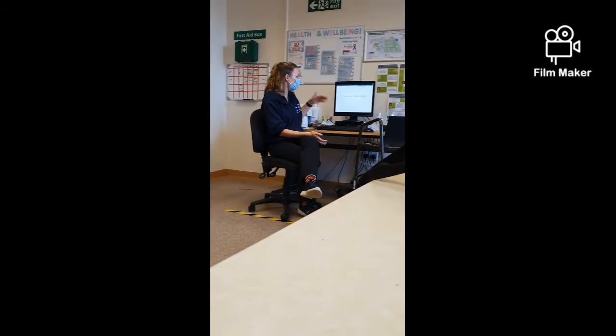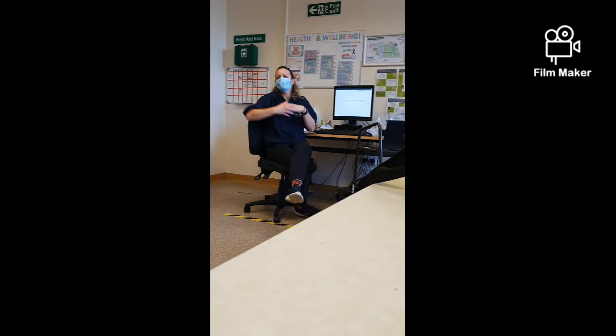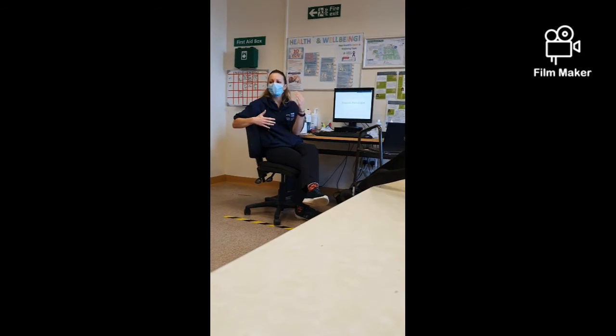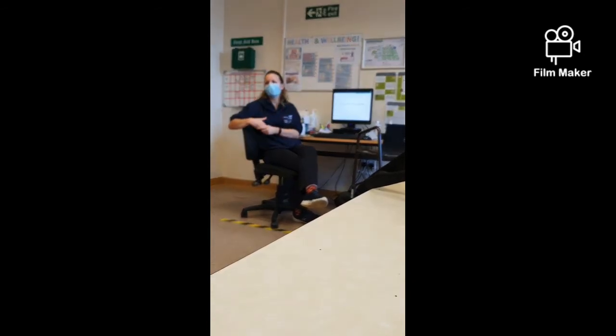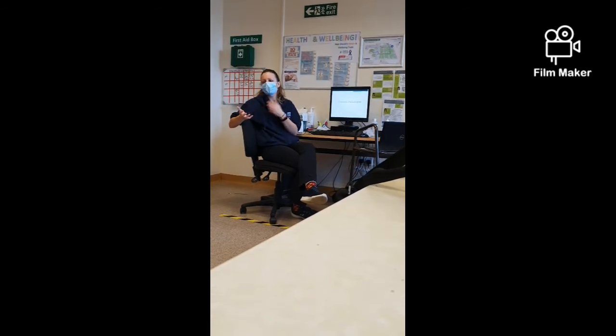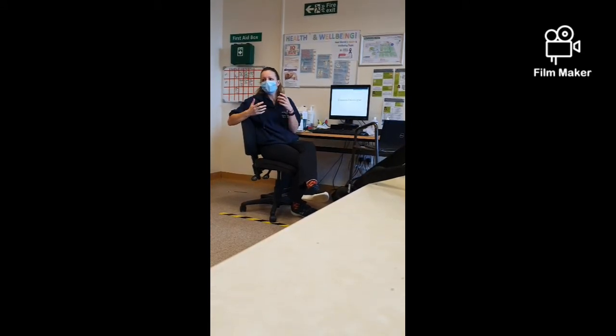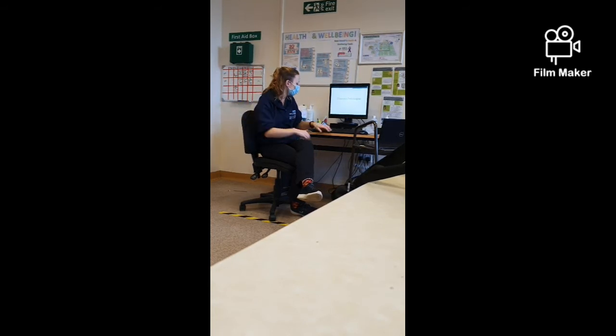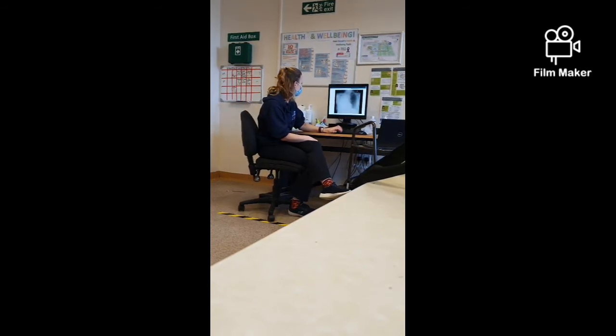Okay. Again, we'll go through some of the common pathologies. So you go through your normal A to E approach, and you can do that for a normal chest x-ray. But when you are going through that approach and you pick something up like a blunting of an angle or a deviation of your trachea, then that's when we're thinking about what sort of pathology that could be. Okay. So we'll just have a look at some common pathologies.